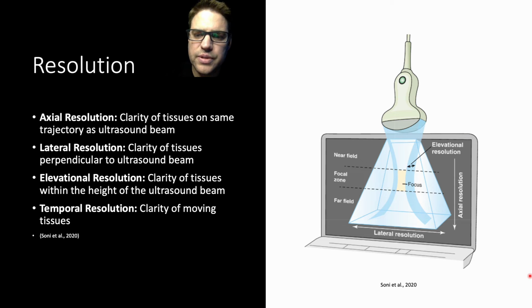Temporal resolution is the clarity of moving tissues. So if you're looking at the pleural line for lung sliding, then temporal resolution would be how clear the lung sliding is.